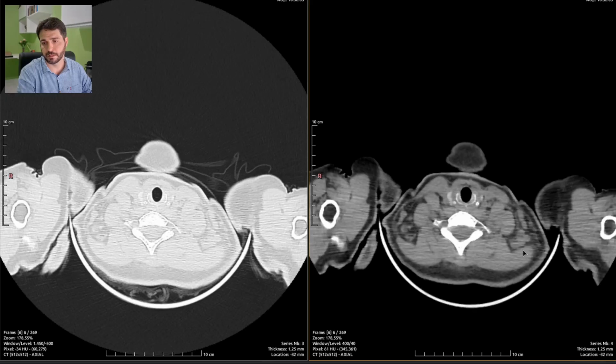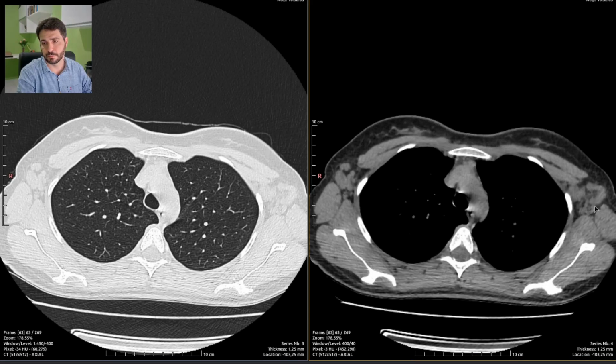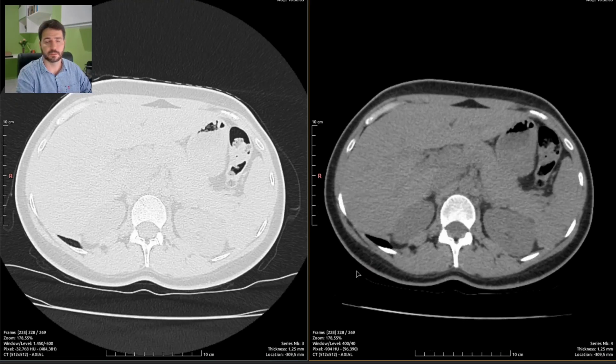In this case there are a lot of cervical enlarged lymph nodes. The largest lymph nodes are over 2 centimeters on the short axis, approximately. So this is something to report. I'm going to report it before I actually miss it.